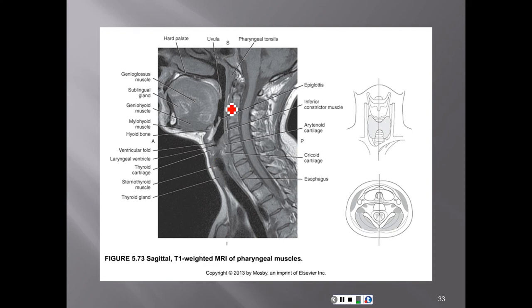And here's the prevertebral soft tissue. And remember the fascial plane, that if there was a fractured vertebra in this level, blood would occupy the fascial plane and would increase this prevertebral soft tissue and move all of the normally seen anatomy forward. Cricoid cartilage, the arytenoid cartilage that sits right on top of the cricoid cartilage. Trachea, collapsed esophagus, that's posterior to the trachea.